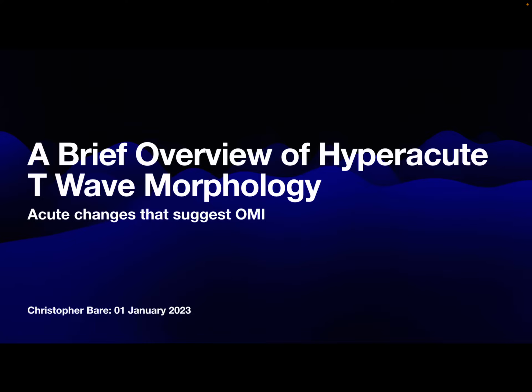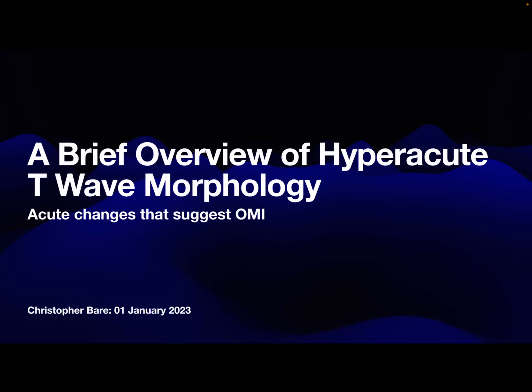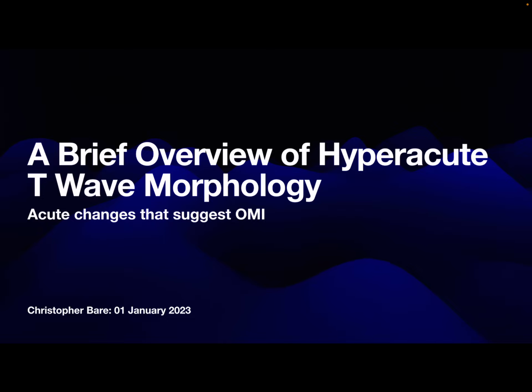These are often some of the first things that you're going to see in the setting of ischemia, injury, and infarction: T-wave changes. We're going to be talking about some specific T-wave morphologies, but T-wave changes in general, when you appreciate them in an acute or hyperacute context, should be quite concerning. All right, well, let's move on.